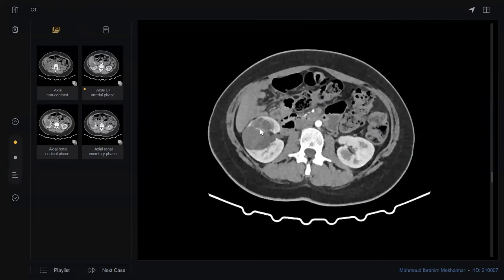I think this could be a small vessel that is actively bleeding within the cyst. No. Could a small vessel enhance less than the renal parenchyma? No. So what's your final classification? I think, sir, this is a grade 2F kind of cyst. Do you think grade 2F has this thick septum in the criteria? No.